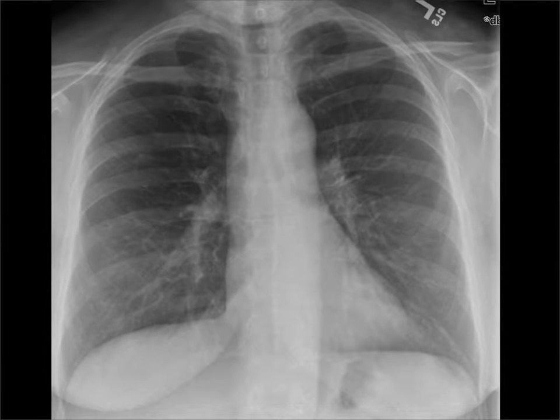So let's move south a little bit. As you come down the bottom of the right paratracheal stripe, you'll see it elongates into a teardrop-shaped structure which lies right above the right main bronchus. Now you can see here that it's superimposed over the superior vena cava, which we'd seen before, so that's going to give you a clue. I'm just going to show it to you again here, this little oval structure here, and that is the azygos vein.